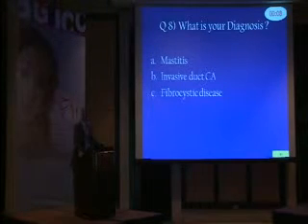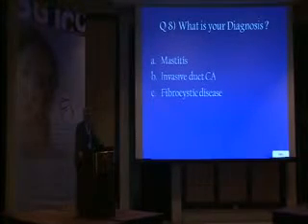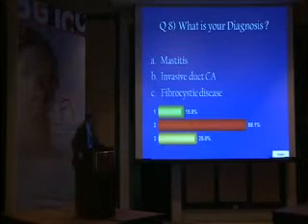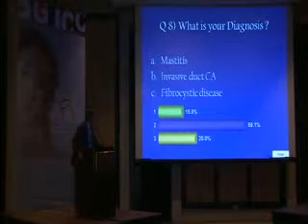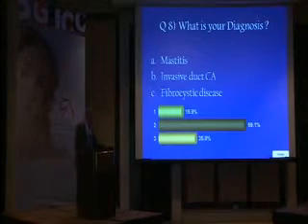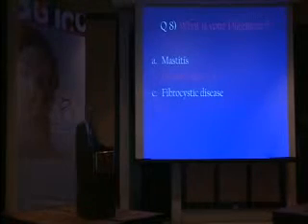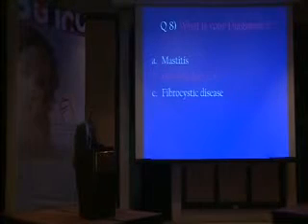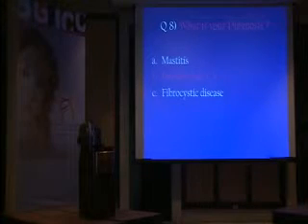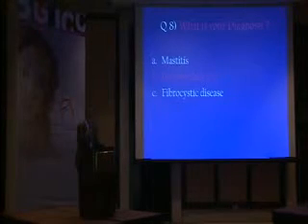Interpretation is very important to reach the diagnosis. If you don't see the signs, you will fail to interpret correctly. Okay. Invasive duct carcinoma, 59%. Fibrocystic disease. Okay, the majority did quite well with invasive duct carcinoma. Cysts usually don't enhance in that manner. If there were an enhancement, it would be a very thin rim, not very thick and clustered in a sense.